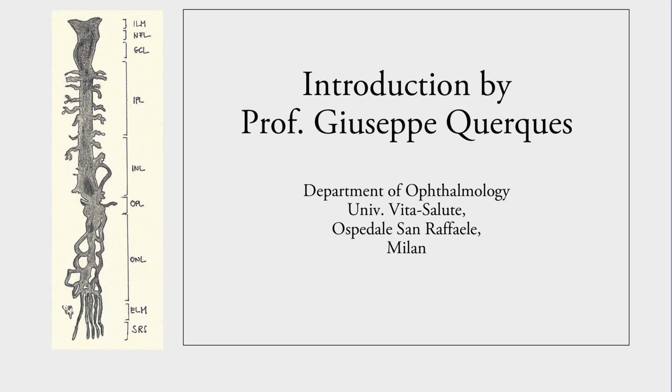I wish to congratulate our friend Pippo Simona because of this little but at the same time huge work of interpretation of structural OCT. In these past years, we have seen a dramatic improvement in OCT imaging, and nowadays we face a strict relationship between in vivo imaging with structural OCT and histopathology.